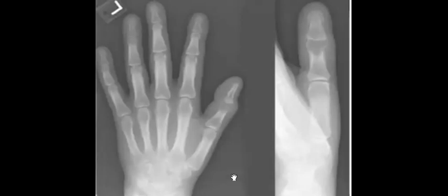So do you see any periosteal reaction or any soft tissue? I see subarticular giant cell metastasis. Yeah, can be metastasis, perfect. Can be giant cell. So you will think about maybe metastasis, perfect.